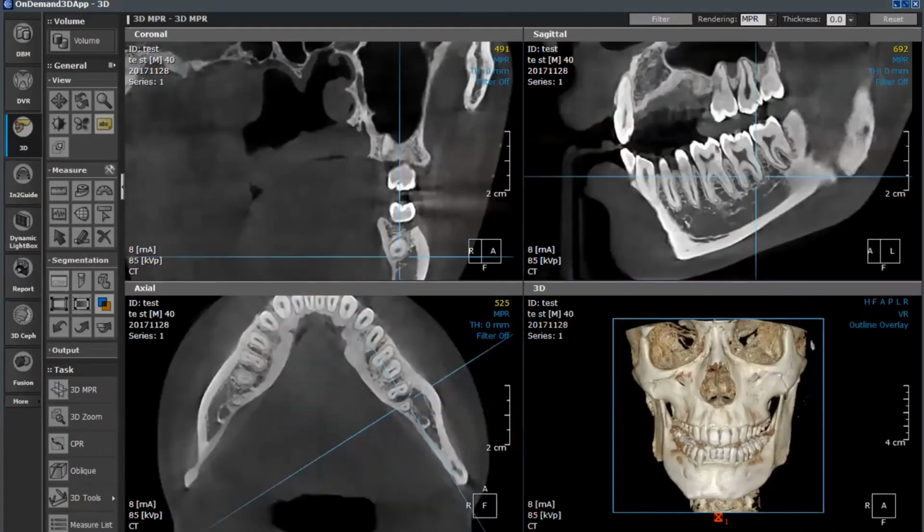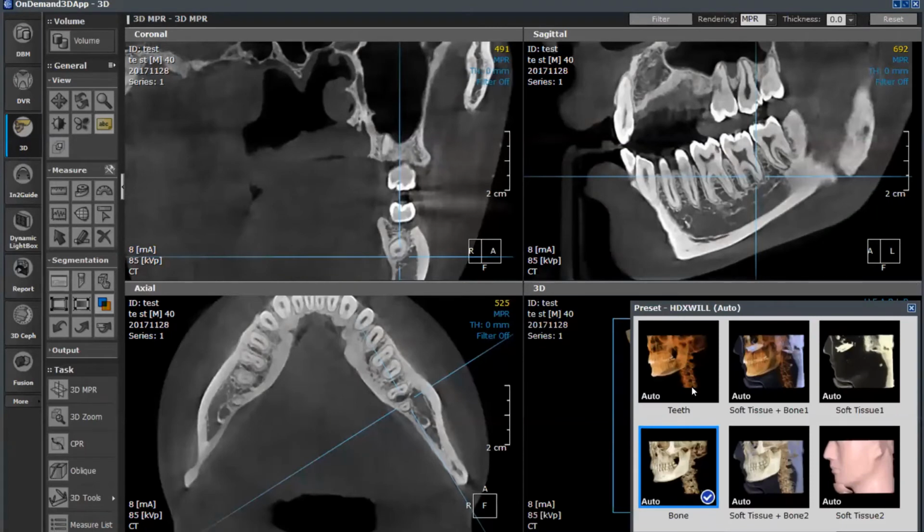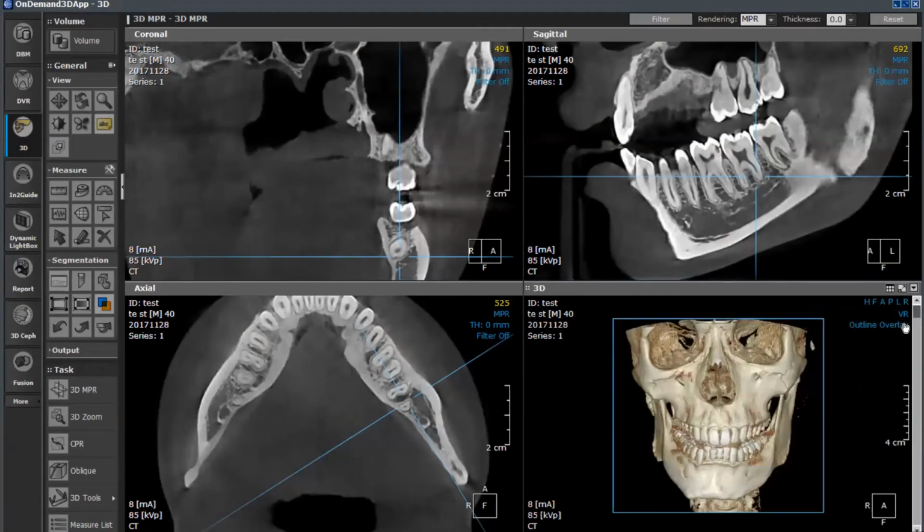We're going to measure. We're going to look at it from a buccolingual perspective. We can break it apart with 3D zooms. We can look at that tooth in a 3D form, looking inside the sinus, outside the sinus, around in the bone. We can also do it changing the bone window. If we change it to the teeth window, that will allow us to look at it more from an X-ray perspective, so we can look at the tissue and bone around there, but also see, again, maybe post-procedural, the obturations as they happen.